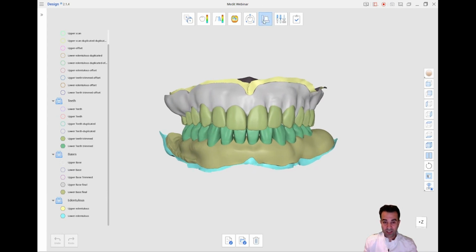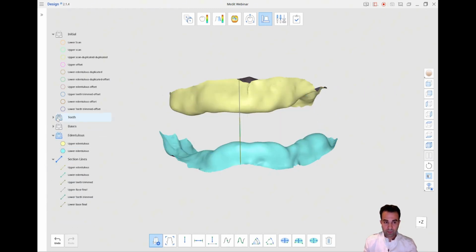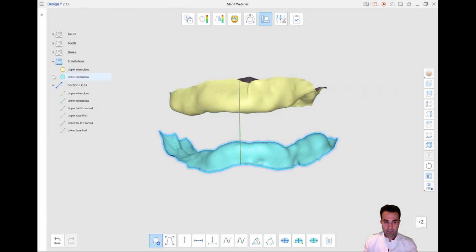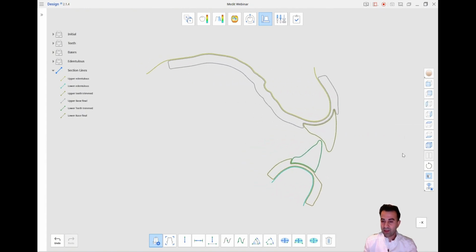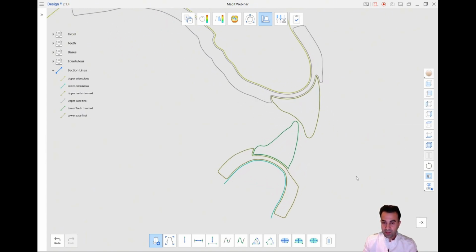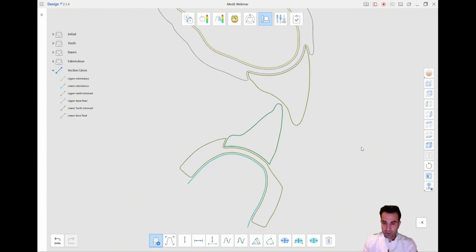One final check. I'll show you a cross section of the project that we've been working on. I find this fascinating. You can see the layers, the spaces with precision.